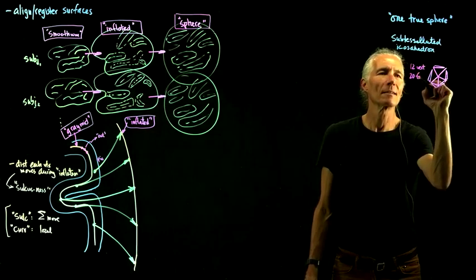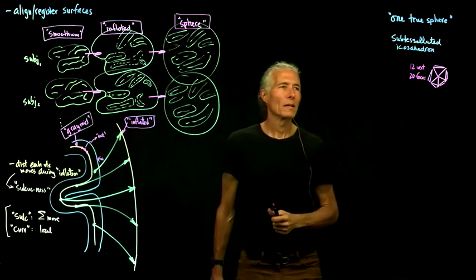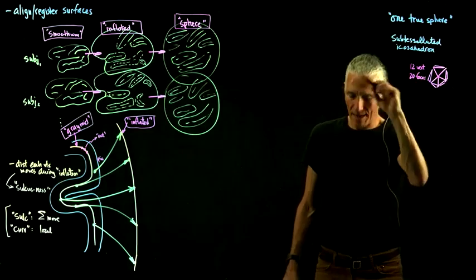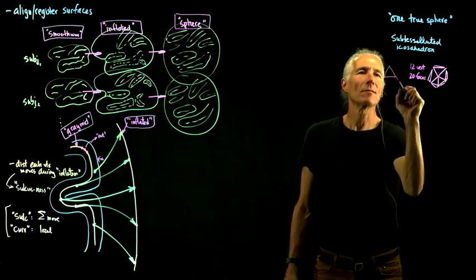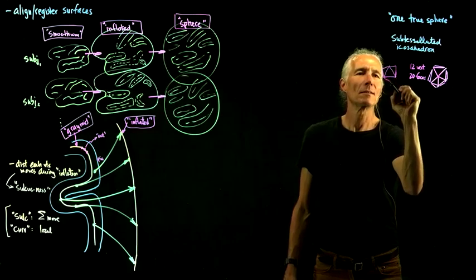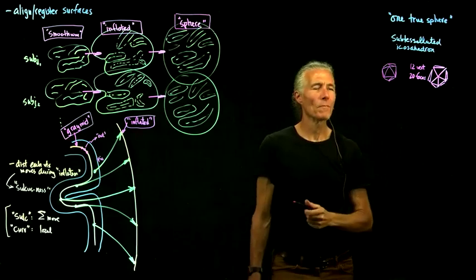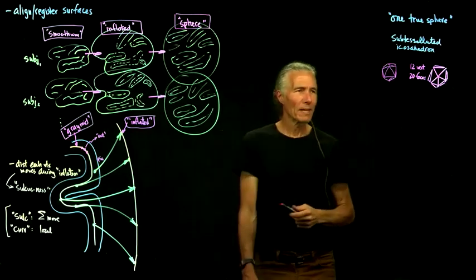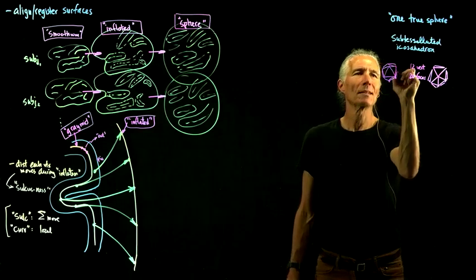That's the icosa part. If you look at it from the side, you can see some of the triangular faces from the side, and the faces sticking out the top. So that's a nice regular surface. Each one of those 12 vertices hits the edge of a sphere.